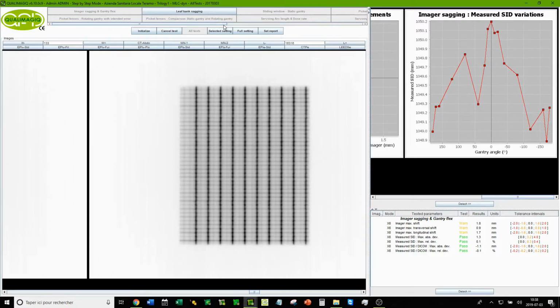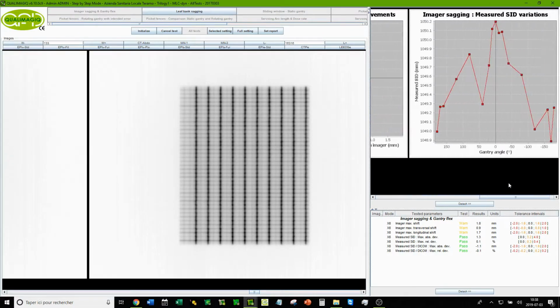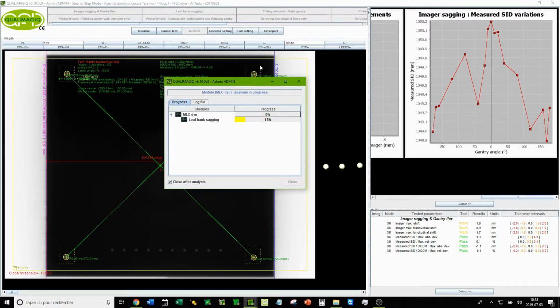The situation is rather simple. You want a very precise image, given that you need to make very precise measurements with tolerances of 0.2 and 0.5 mm, and unfortunately during the photo shoot the camera moves. Given that we measured the movement of the cameras during the shoot, we will correct the images for the camera movement as we were able to measure it.